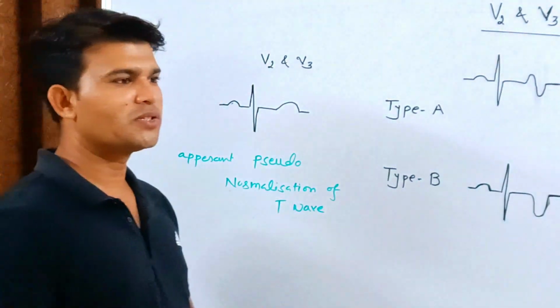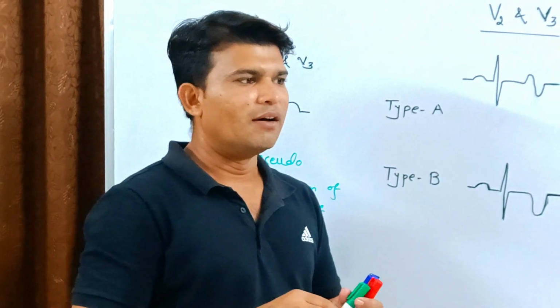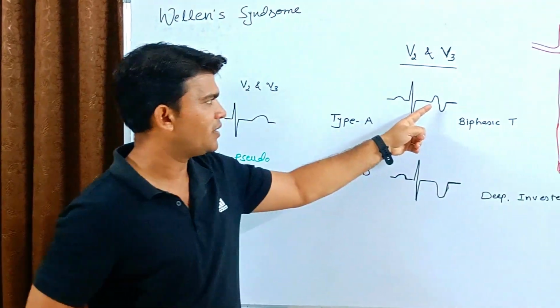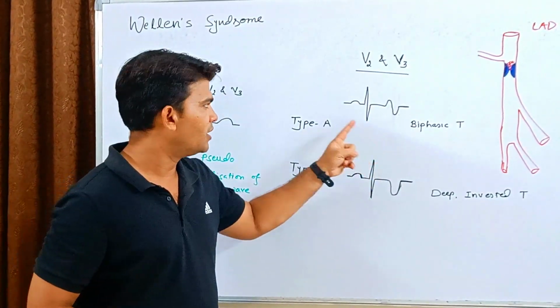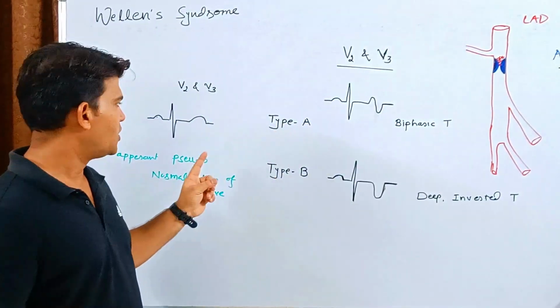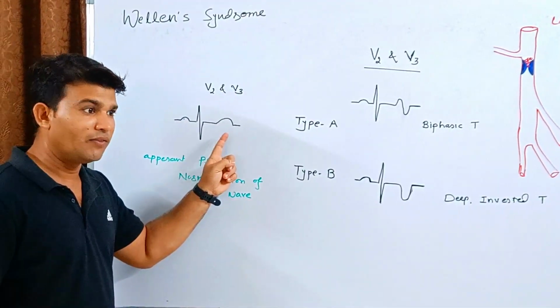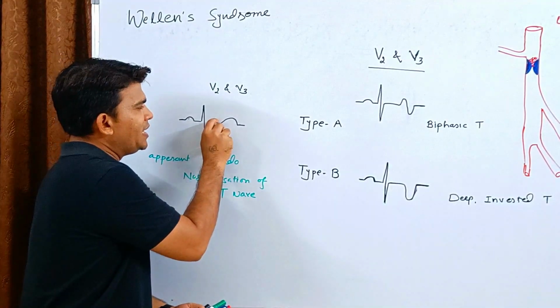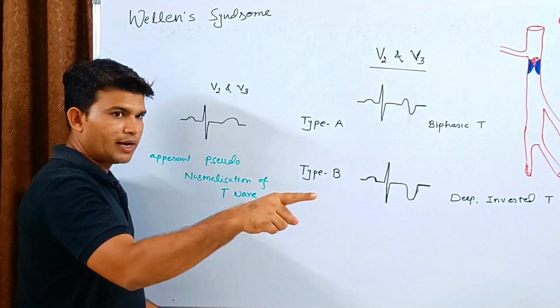Basically, in myocardial infarction, what is the mechanism? Let me discuss. If the LAD is critically blocked, then the Wellens pattern will be seen. In a Wellens sign patient, now you see an upright positive T wave with the signs and symptoms, right? Or the ST segment may be slightly positive, not more than 1 mm, less than 1 mm, right?